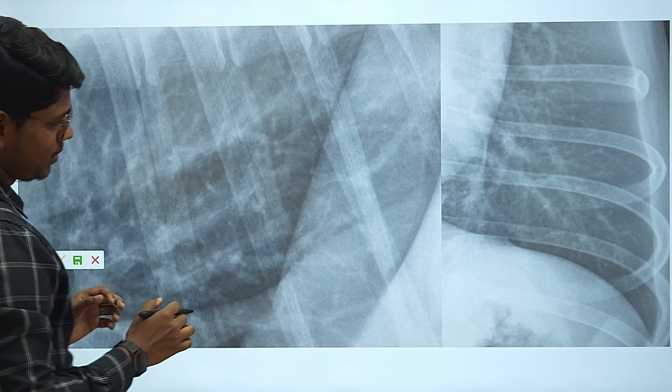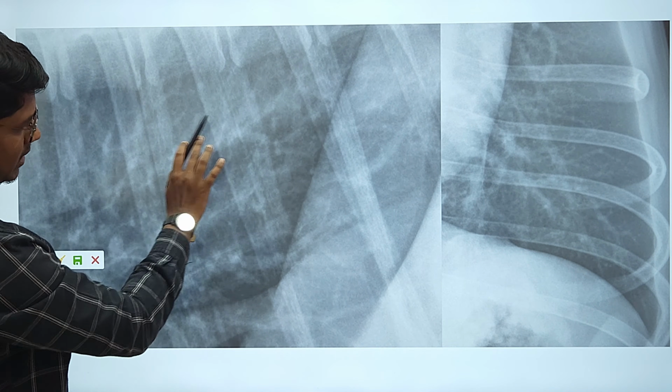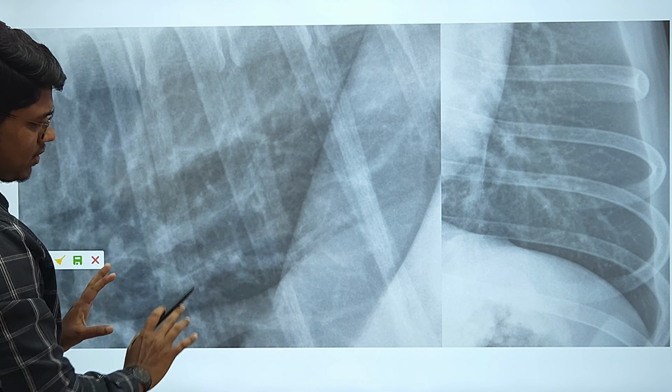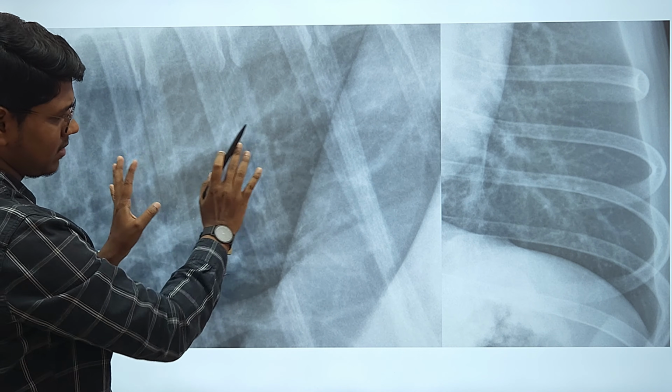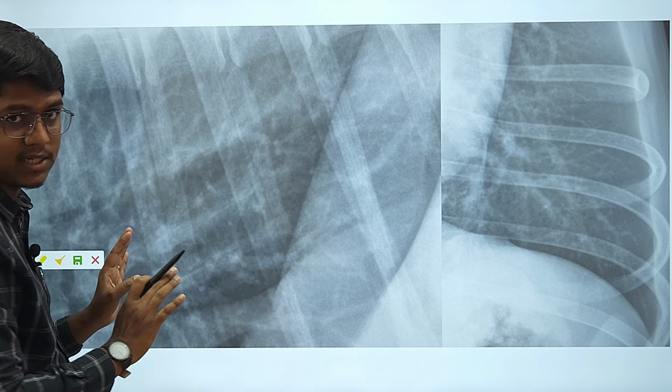Here, this is a zoom in view. We can see that this is a dorsocaudal location. Zoom in view, we can see some networks here and there. It is not exactly black. Air provides a background actually, over which this interstitium is visible as networks.